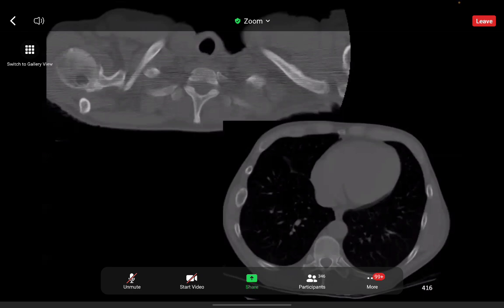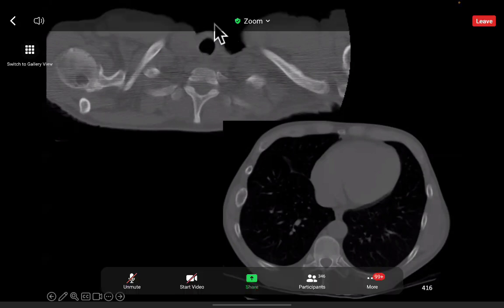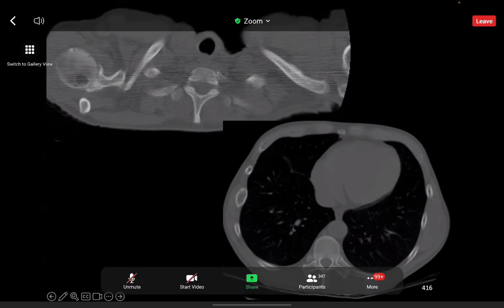And that kind of acts like a primary parathyroid adenoma. And one of the treatments is to remove the parathyroid gland. And that's what's happened here. So it's quite a nice case illustrating the radiological and musculoskeletal features of hyperparathyroidism.